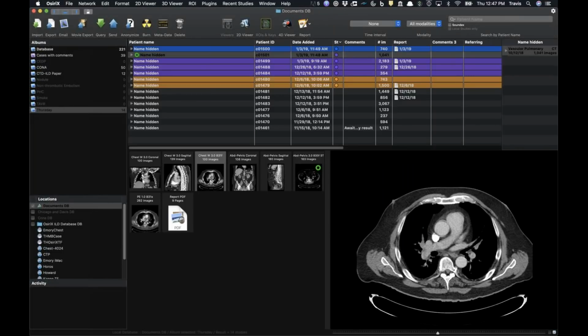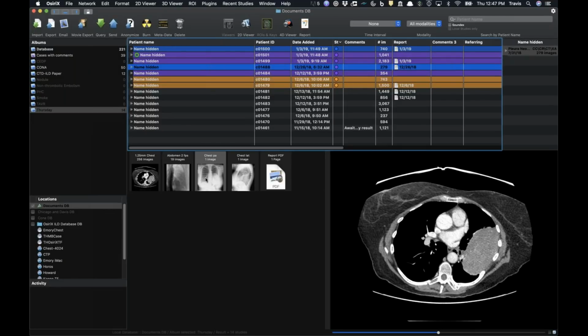So, yep. Is this just bland embolism? This isn't tumor embolism. No, he doesn't have a tumor. They just wanted a second opinion. He was having some mental status changes, and they thought maybe he had a paraneoplastic syndrome, but nobody ever found a tumor in him. So this is just bland embolism. Okay. All right, we'll go to this one.